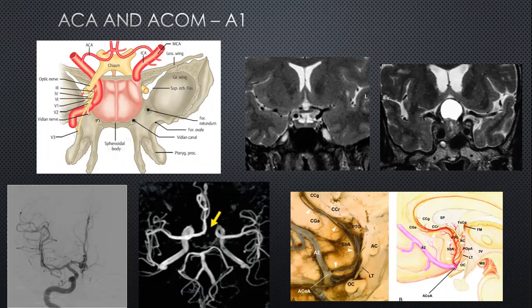Moving on intracranially now towards the anterior cerebral artery and the middle cerebral artery. The anterior cerebral artery is the smaller division, but it used to be the more dominant division. We have looked at this during embryogenesis, because the MCA developed much later on as merely an offshoot of the ACA of the striate branches, as the superolateral cortex started to develop much more dominantly. And though it looks bigger, it is in a sense a derivative of the striate artery itself.